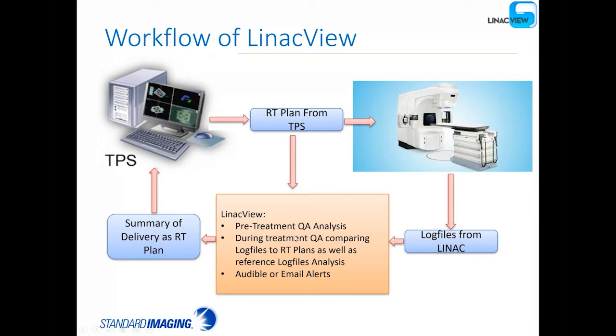One can do pre-treatment QA analysis, of course, if the plan is exported and delivered before the patient arrives, and also during treatment QA comparisons for every fraction of every patient treatment.